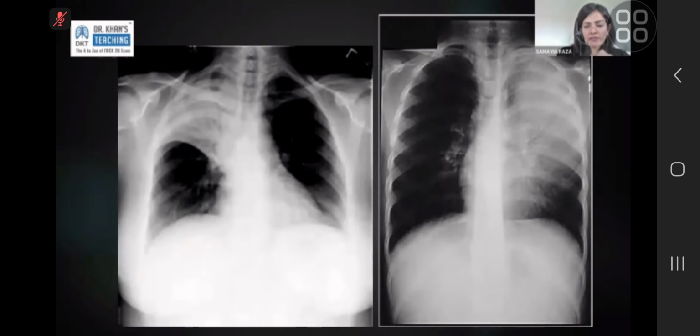So when we say infection, this is the barn door appearance, when we think of a very clean looking, isolated lobar consolidation with very clear air bronchograms through it. But obviously real life doesn't look like this. When you think of an image that would make you very happy labeling it as infection, the history states the patient came in with a fever and a cough, and this is what the X-ray looks like. Obviously, it's much easier to report that X-ray.